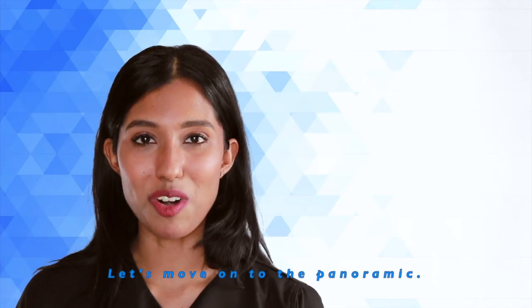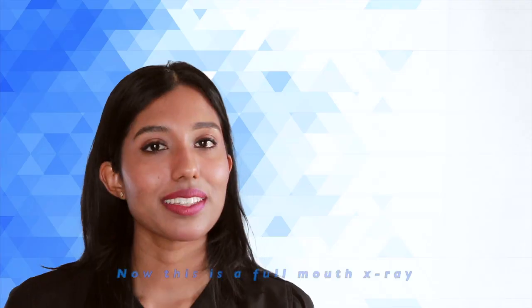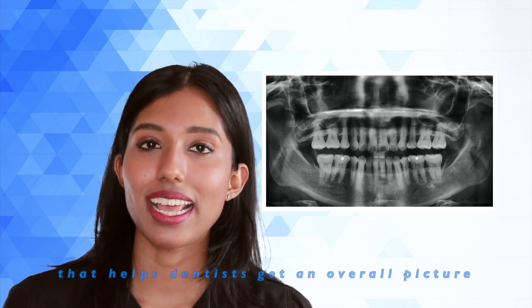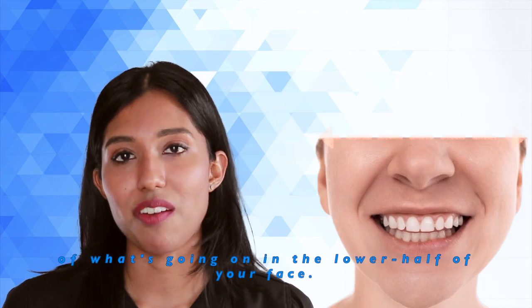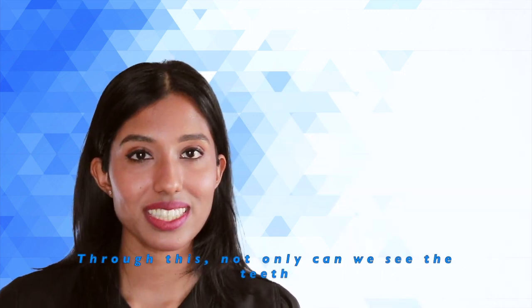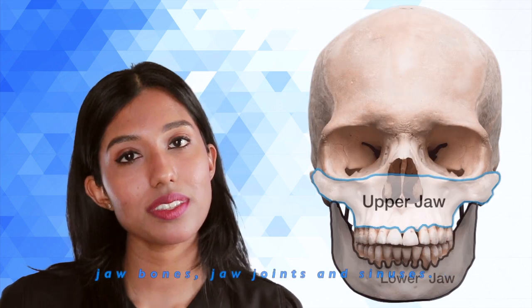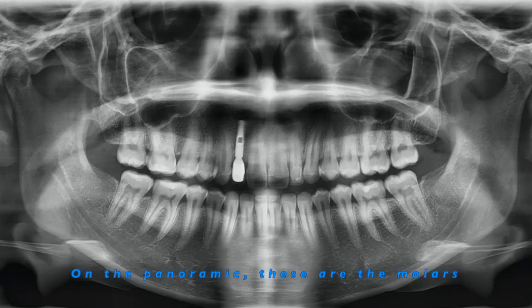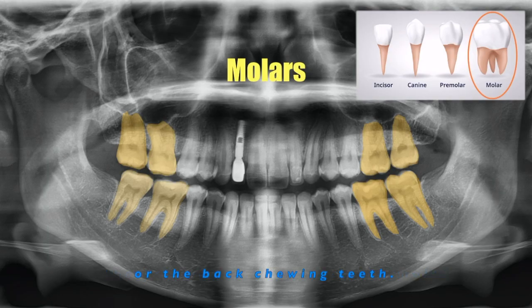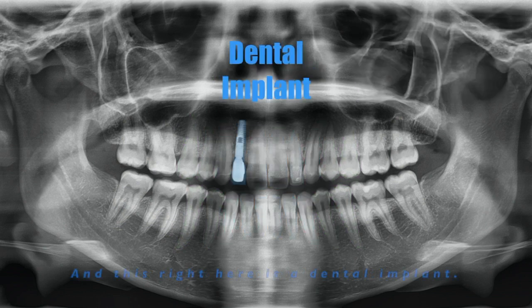Let's move on to the panoramic. Now, this is a full mouth x-ray that helps dentists get an overall picture of what's going on in the lower half of your face. Through this, not only can we see the teeth, but also appreciate your upper and lower jaw bones, jaw joints, and sinuses. On the panoramic, these are the molars or the back chewing teeth, the premolars, the canines, and the incisors. And this right here is a dental implant.